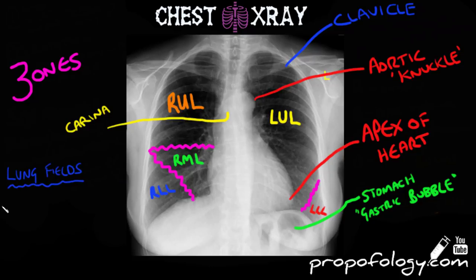We're going to be doing more videos on certain pathologies you can see on chest X-rays, because whenever you're looking at the lung fields, you should consider whether there are certain things within them. You should consider, is there any consolidation in any of the lobes that we've talked about. You should consider, are there any collapse of those lobes. You should consider, is there any pneumothorax, so is there air in the pleural cavity surrounding the lungs, until the lung fields not quite go to the end.